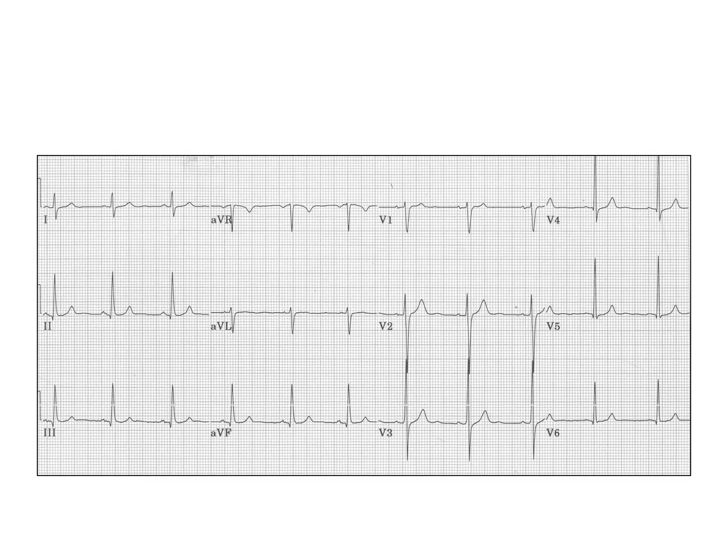Let's look at this one. Lead 1 is isoelectric, so we know electricity is going perpendicular to it, so either straight up or straight down. We'll compare leads 2 to AVL. Lead 2 is strongly positive, AVL is quite negative, so we know it's going down, which would mean that AVF would be strongly positive, and it is, and 3 is quite positive as well.